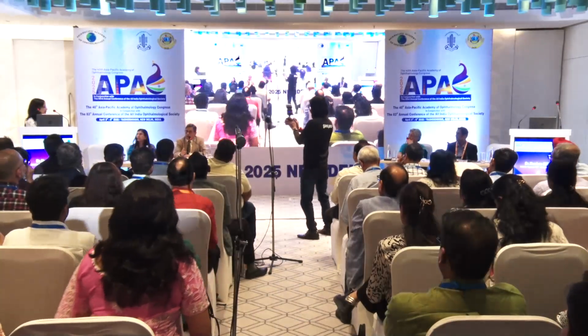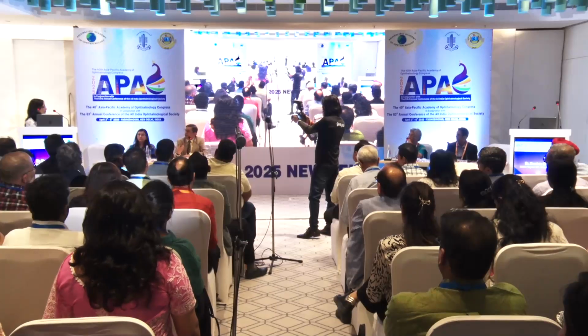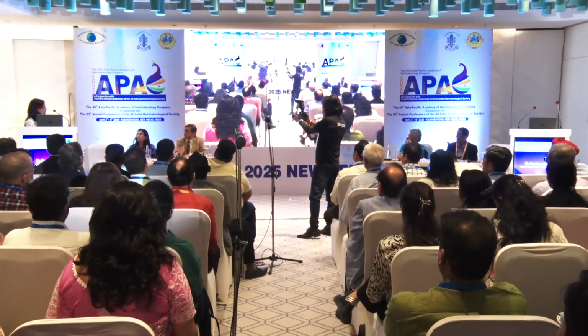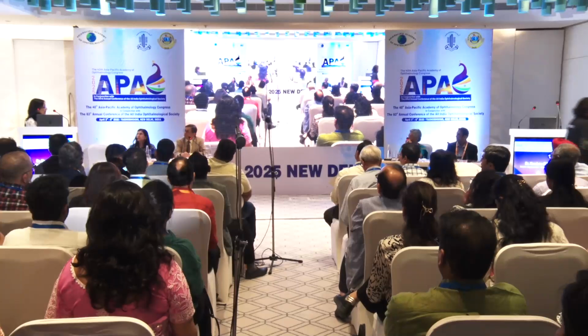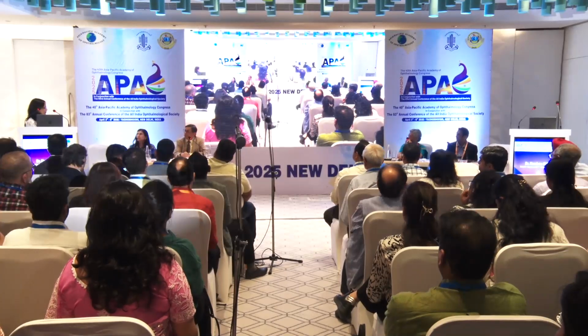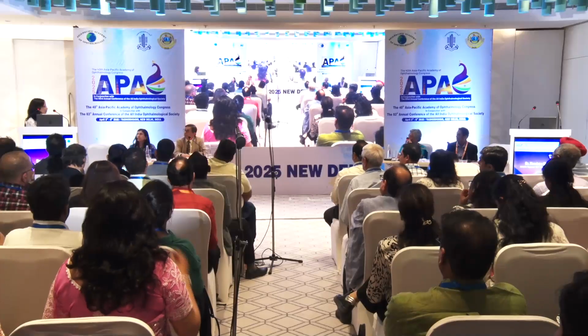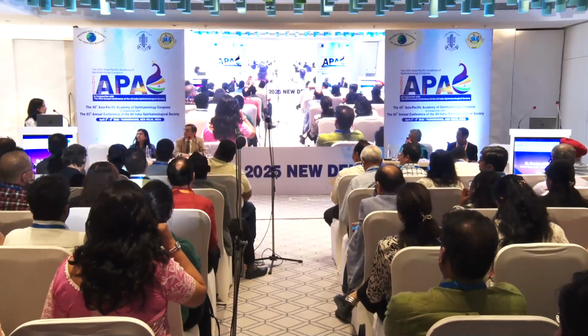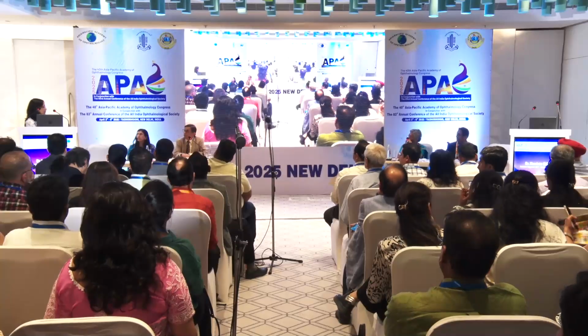And even without an intraoperative OCT, you could do a descemetopexy, isn't it? Chances of entering a wrong plane are there, and sometimes we have to retake the patient to the OT. So those chances are minimized. Though these days, it's more of an academic tool. We learn a lot by doing intraoperative OCT. It's not necessary, but it's an additional tool.